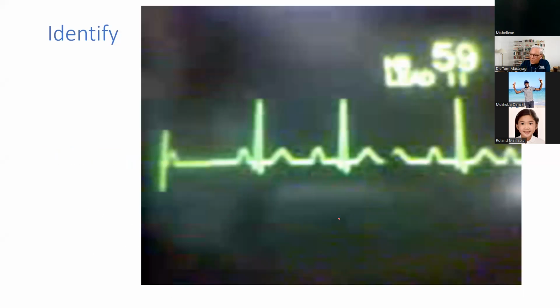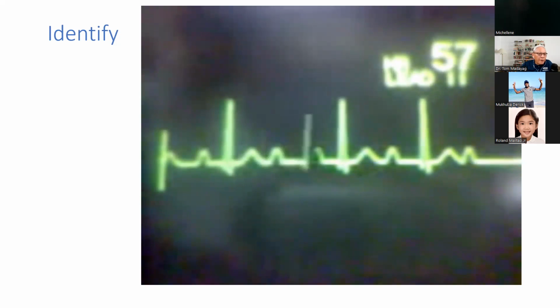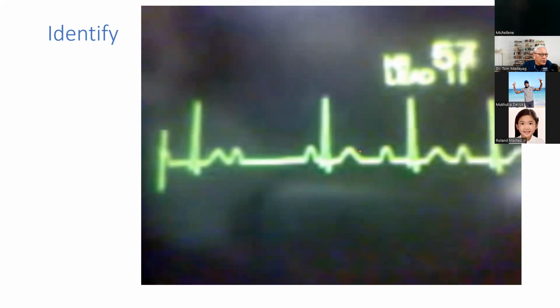Okay, as you could see, there are missing QRS complexes, meaning to say that there is a P wave without the QRS complex.